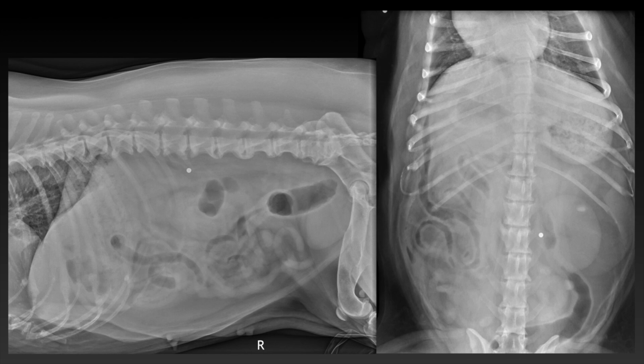Today's example is a 9-year-old female spayed medium-sized crossbreed with diarrhea, vomiting, and hyperexia. Once you have reviewed the radiographs using your systematic approach, then you're ready to watch this video. Now I will highlight the most important findings for these radiographs.